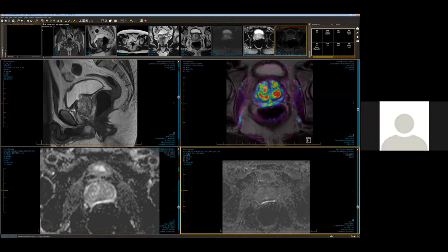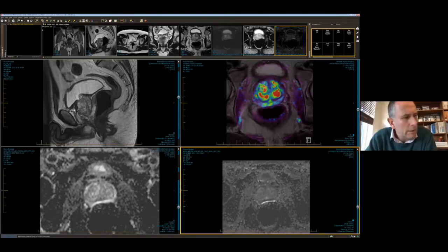When we've got any artifact, we rely on the post-contrast more heavily. This is an older study. It's now 3 or 4 years old, and we've been giving patients bowel preparation since about then. So our callback rate has dropped substantially as a result of that, and we hardly ever call anybody back now that we give them a bowel preparation. Yep. Okay.